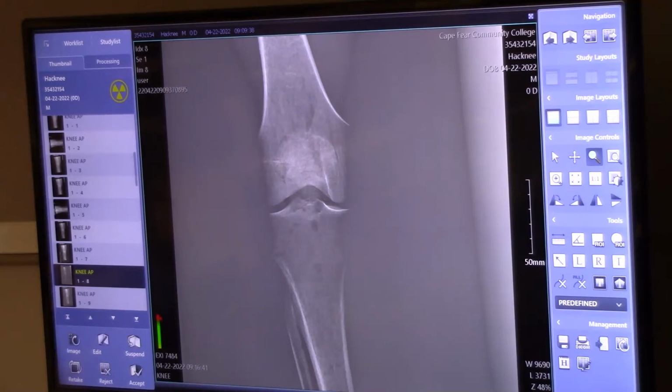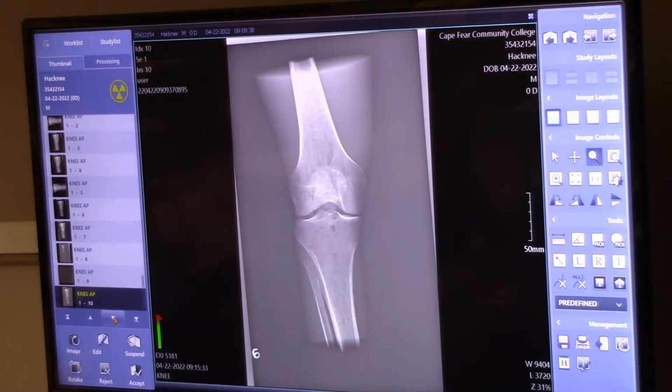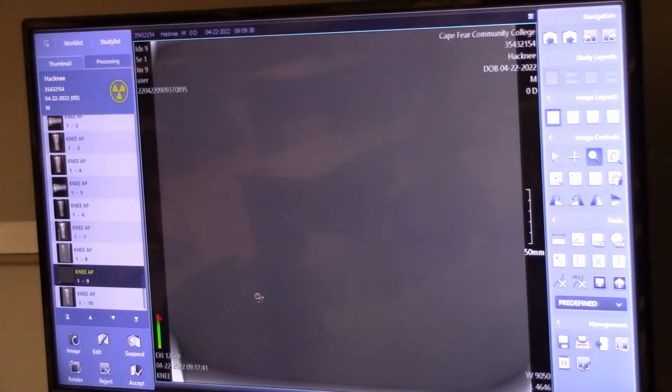Okay, so this is no good. That's no bueno. Okay, number 7. Okay, this was 7484. Oh, this is number 6. I got it out of position somehow. Okay, there's number 6. Somehow or another, number 6 it's haunting me. Okay, this was number 7. This was number 8. Okay, this has an exposure index of over 12,000.